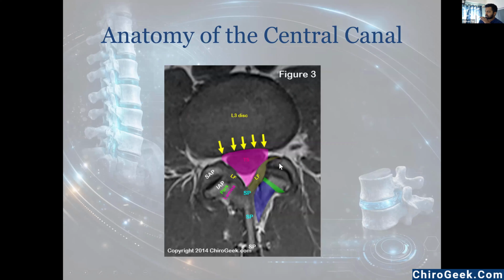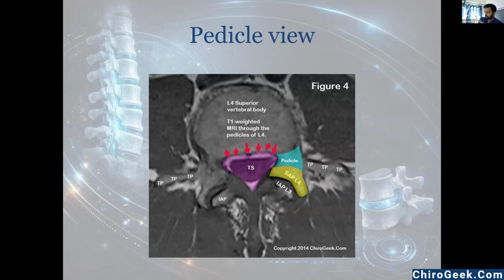And this is the exact disc cut. This is the one level below. If you see the boundaries of the canal, the lateral boundaries will be the pedicle, superior articular process, and the transverse process will also come.